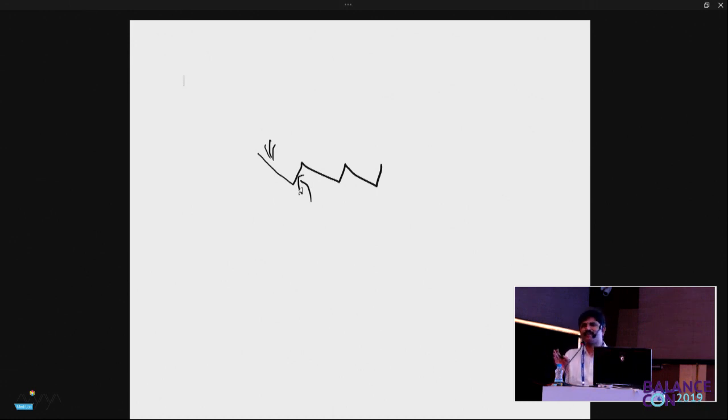Some amount can appear because of goggle tilts, but significant is not expected. So if there is a significant horizontal nystagmus, as seen here, it probably represents an underlying vestibular tone asymmetry. This person could have had a vestibular neuritis on one side, or is being seen at a time when he is going through an acute attack of Meniere's disease, whatever it is.